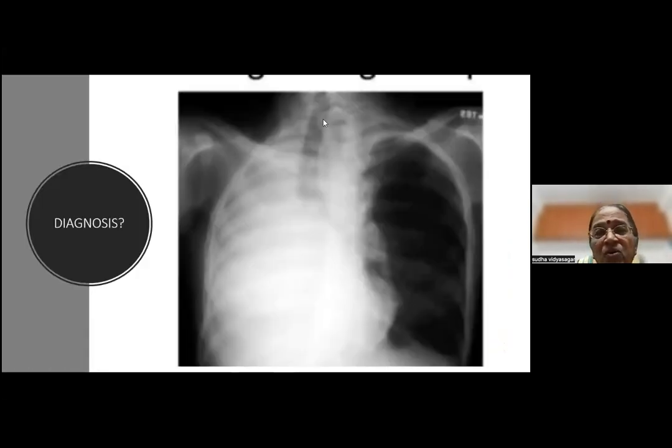Right. Let's go to the actual quiz kind of thing. So let's look at this. Simple diagnosis. Diagnosis, please.